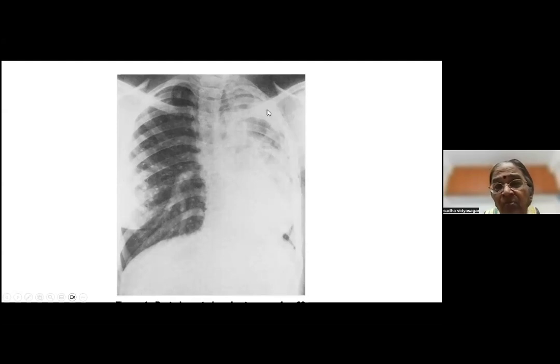And like what we told, the size of the left lung is about 40% of the right lung. The right lung has gone in for a compensatory emphysema with the pushing down of the diaphragm and widening of the rib spaces. And there is one more thing there. We don't know what it is. And definitely there is a good amount of fibrosis.